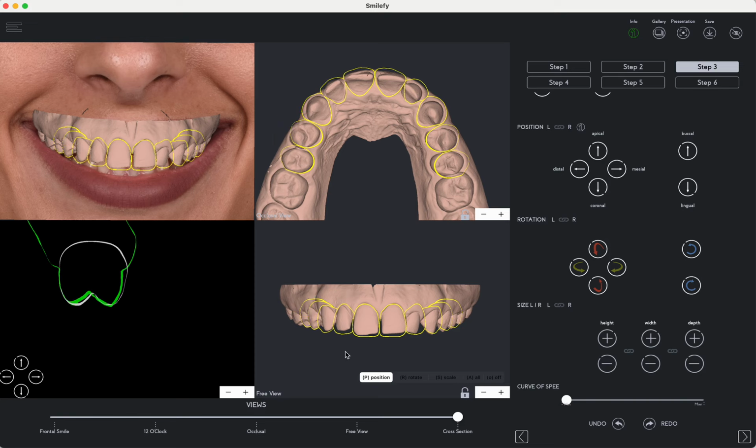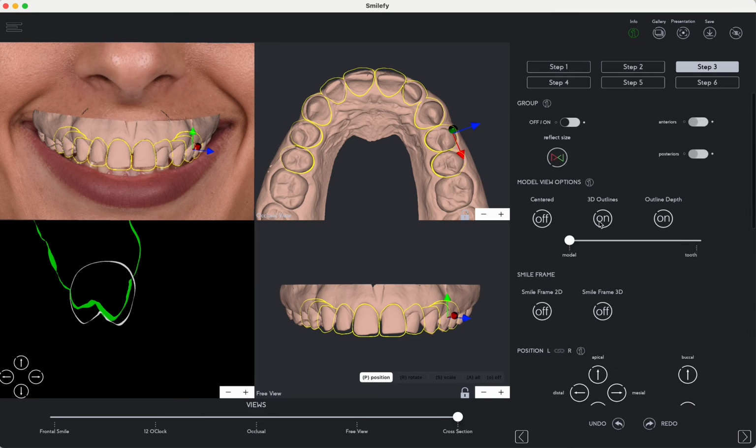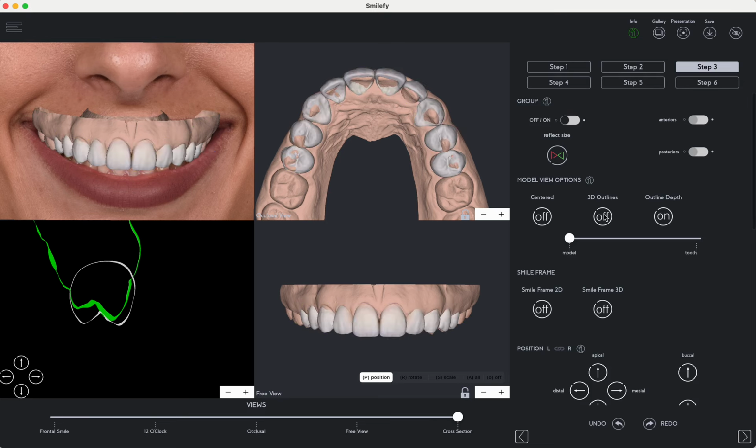I follow here the occlusal curve, and I think that's something that we can work with. I check the thickness. So from the ideal design, I can make sure here I have my very quick adjustments, like this. Let's check the design now with the templates. Here is my mockup design.